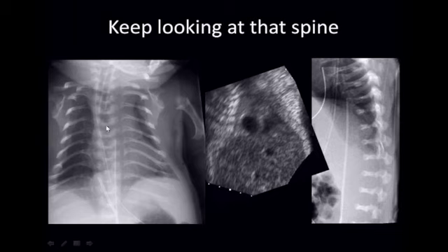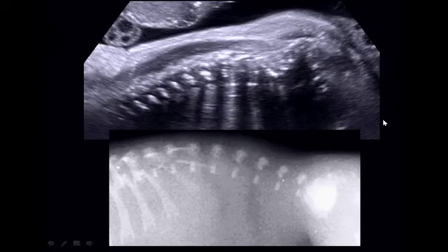But look at these vertebral bodies. There's only a little bit of calcified vertebral body and a whole lot of intervertebral disc space. Same on the lateral. The vertebral body is very flat, the intervertebral disc space is large, and this is described as platyspondyle, meaning flattened vertebral bodies.